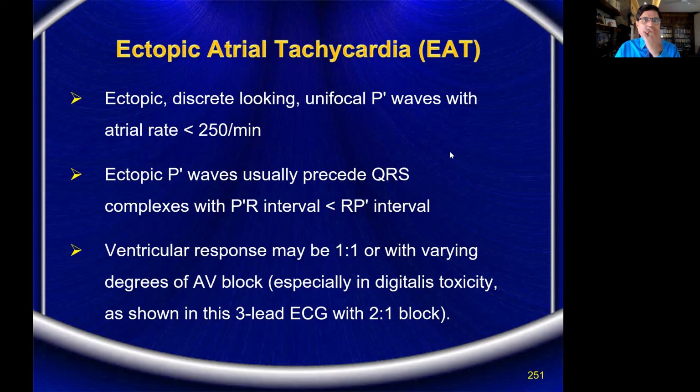So that means normally the tachycardia occurs from the sinus node. It is called sinus tachycardia. That means the beat is originating from the sinus node, and the complexes, P, QRS, or ST, are perfectly the same as any normal ECG, but there is an increase in the rate. Okay. Supposing the impulse is not generated at the sinus node, but in an ectopic focus in the atrium.